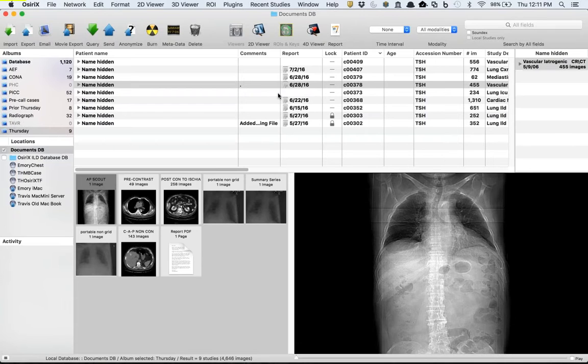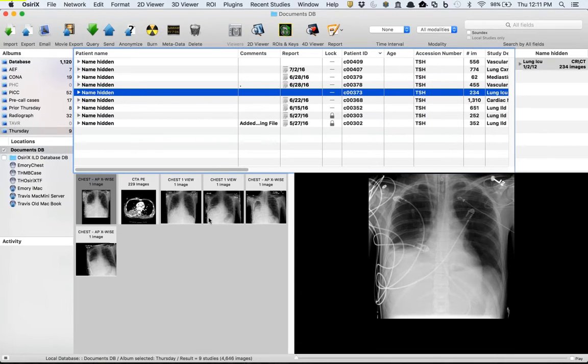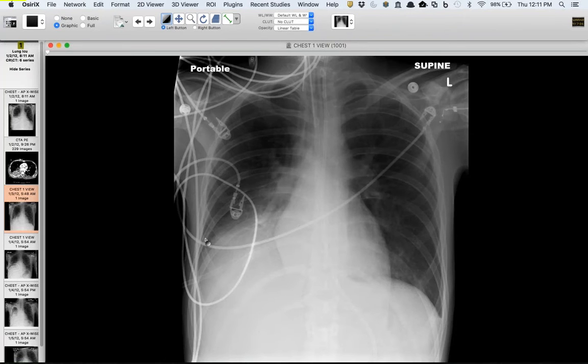So interesting. This is a really cute radiograph, and Howard, this was your case that you showed a couple weeks ago. I think it was the isolated left upper lobe collapse, sparing the lingula. Here's a patient. You can see he's intubated. He's got right lower lobe atelectasis at this time, maybe a little bit of left lower lobe atelectasis.